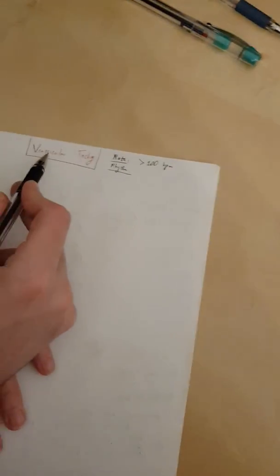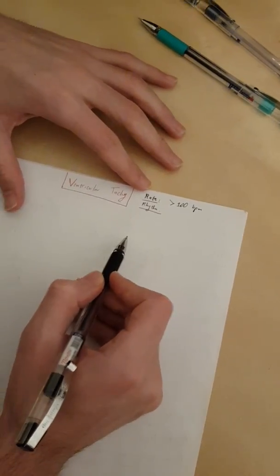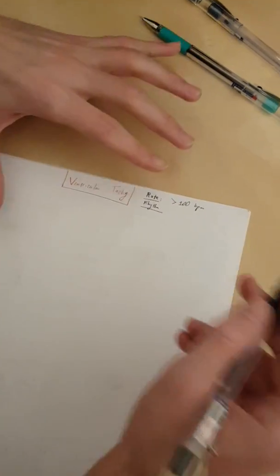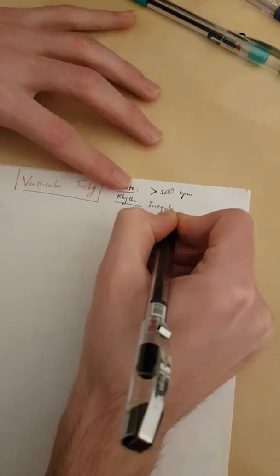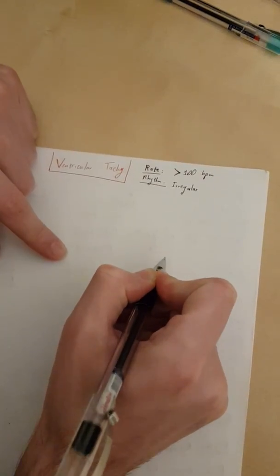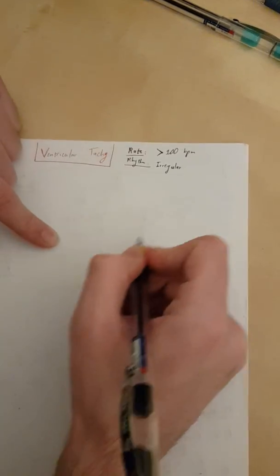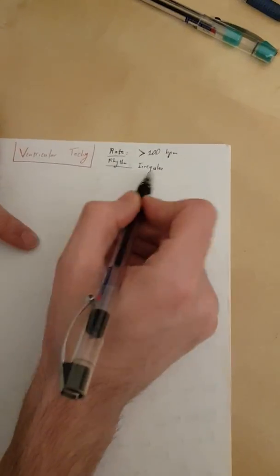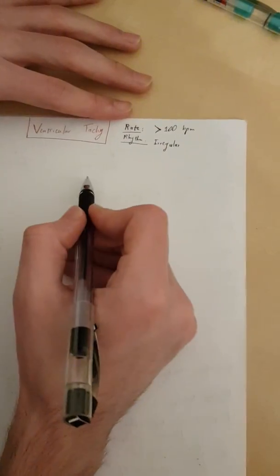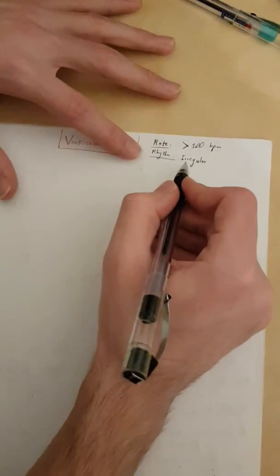Would you think that ventricular VPCs would come at the same rate? Do you think an ectopic focus from the ventricle can give a normal rhythm? Of course not. So it's irregular. Unless it's monomorphic, meaning it comes from the exact same focus, then it will keep giving you the same rate. It becomes a pacemaker basically, so it gives you regular beats. But anyways, this is really easy. You just look at the ECG and see if the RRs are really random or not. Probably they're going to be irregular 90% of the cases.